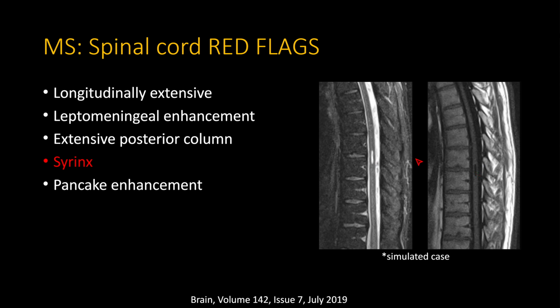A lot of times, myelitis lesions can be almost equally as bright as CSF on STIR and T2, but then on T1 they will not be equally as dark. So that's what distinguishes a syrinx from those other lesions. When the syrinx is very small and thin, it can be difficult. If you see something in the center of the spinal cord, you can somewhat hedge a little bit, but typically a syrinx is not going to be that much of a diagnostic dilemma.